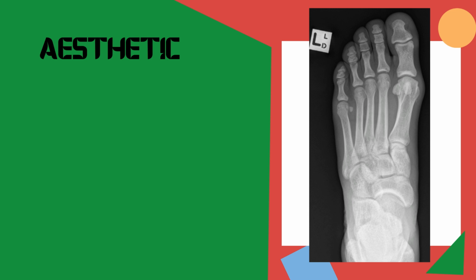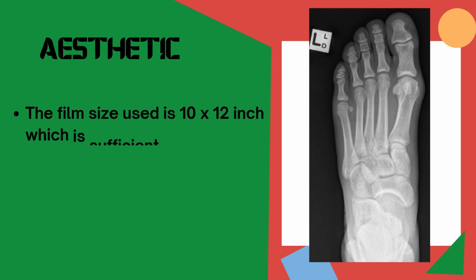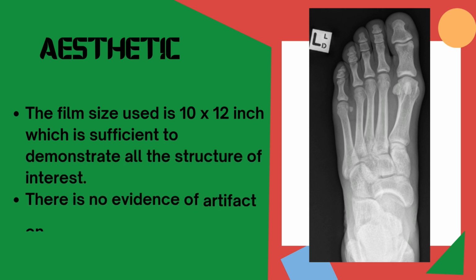The next component is aesthetic. The film size used is 10 x 12 inch, which is sufficient to demonstrate all the structure of interest for an AP foot X-ray. There is no evidence of artifacts seen on this radiograph.